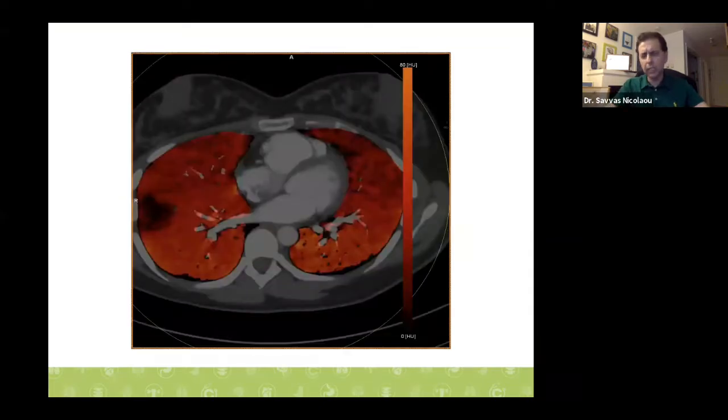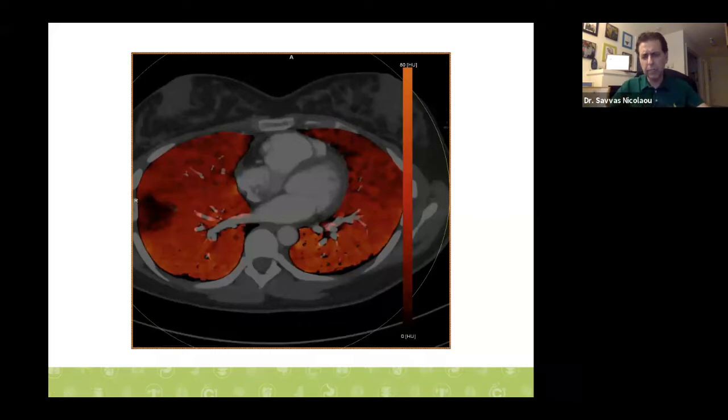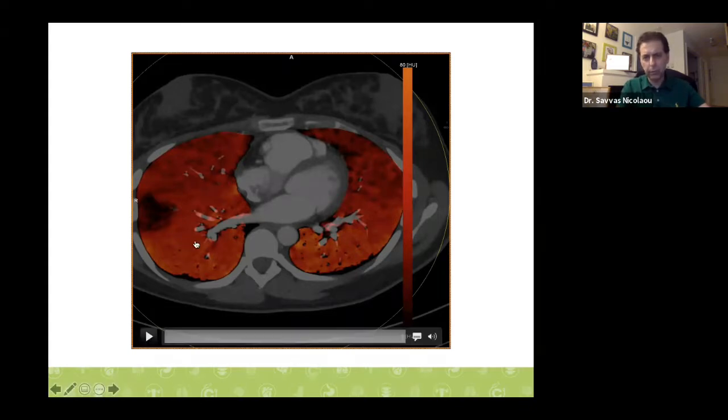So we can switch to color-coded images nowadays with CT. And basically on this one single image, we can see that the bright orange is the iodine that is present in the lung parenchyma that is distributed based on the integrity of the pulmonary vasculature. We can see in the left lung, this is anterior, posterior, right and left ventricle, right atrium, left atrium, the pulmonary veins. We can see nice homogeneous distribution of the iodine within the left lung.